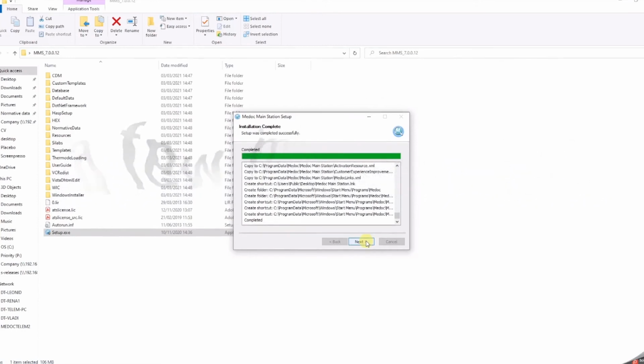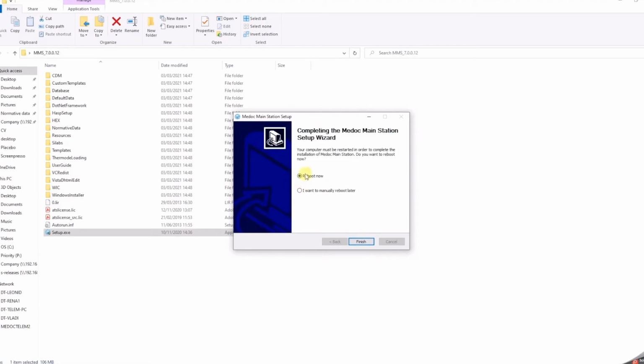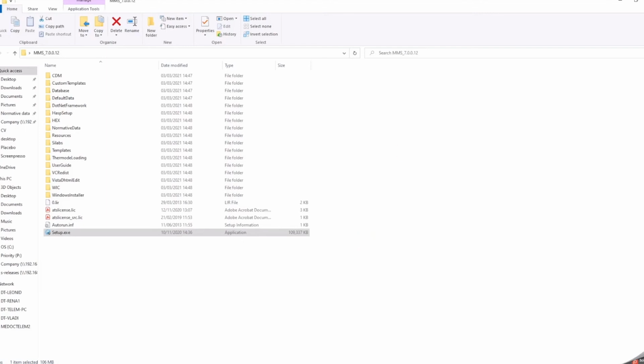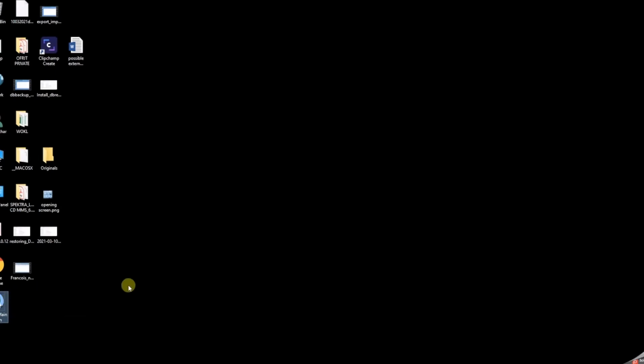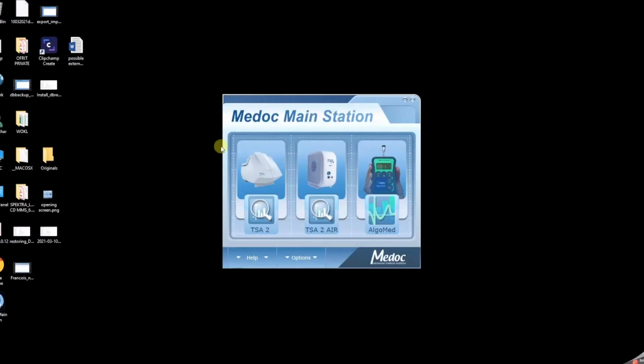And now we're done. So let's press Next. We don't need to reboot right now. We can do that later. So you can choose that. And let's finish. It's closing this up. Let's open Medoc Main Station software. And you can see that we have the welcoming screen.